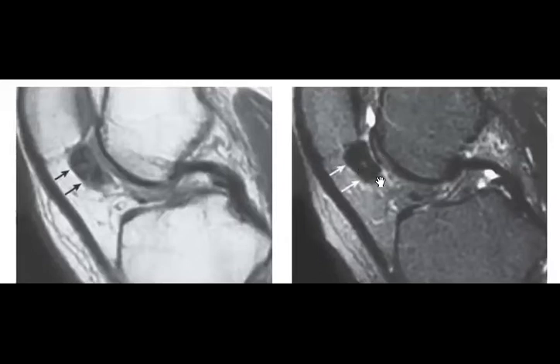So you can find the blooming artifact if you have the appearance of hemosiderin, right? So pigmented villonodular synovitis, they like it in the exam, which is an easy one. Okay, we already have some cases similar to this one. Okay, let's shift to another one.